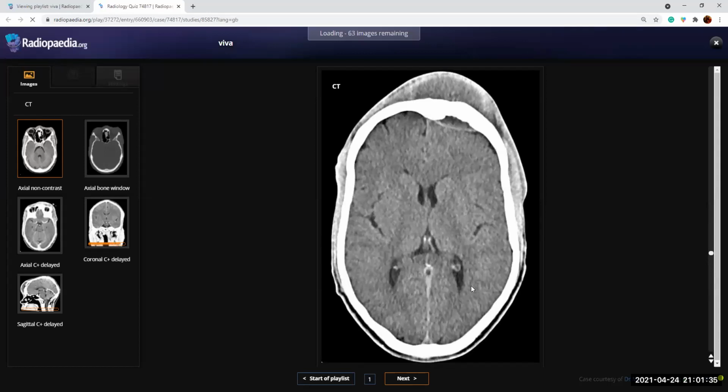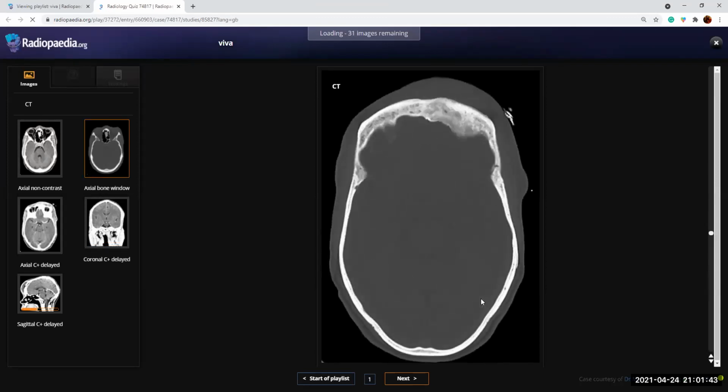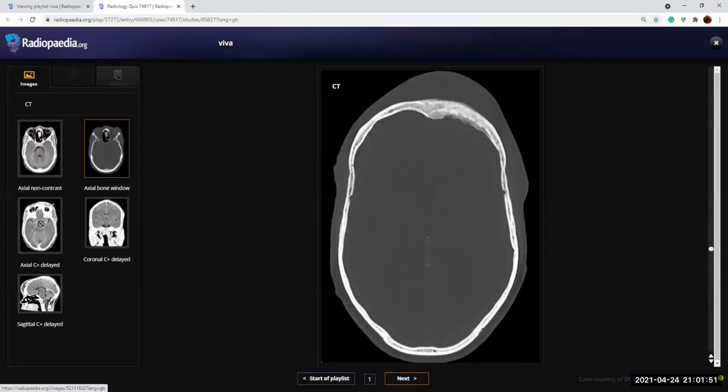So if the patient has been operated. The patient did have a procedure earlier. Okay. Yeah, there is a bony defect basically with collection at present. So if the patient presents with any history of post-procedural pain, fever or headache, then this could be a post-infective or post-surgical collection. This patient has been having the swelling since quite a long time. Okay. The procedure was not recent.